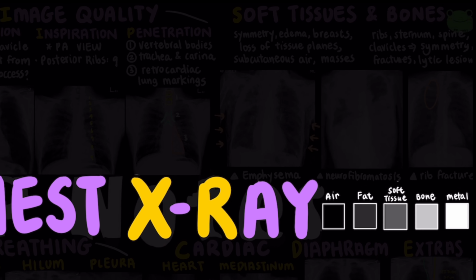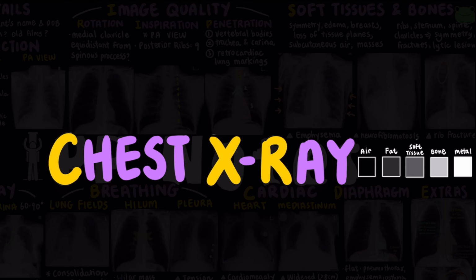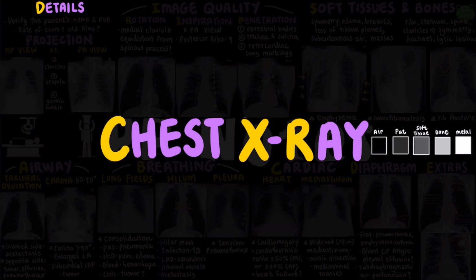Now let's go through each step of the DRS-ABCDE system. D stands for details. Always verify the patient's name and date of birth. Check the date of the exam. Are you comparing with old films? Is this a new change or a chronic finding?